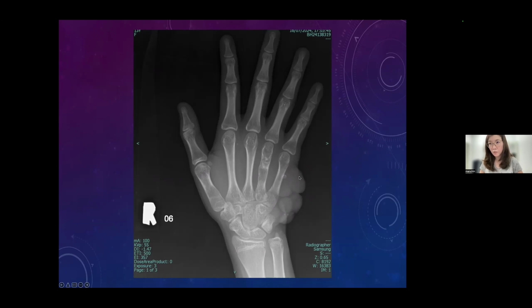So look at the soft tissue nodule. Can you see all these calcifications? Yes. All these calcifications, we call them phleboliths. So it's within the soft tissue nodules. So when soft tissue nodule with phleboliths, I think hemangiomas, soft tissue hemangiomas.